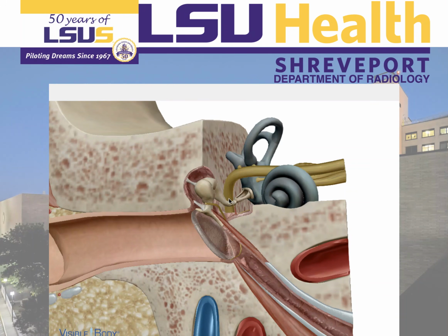The ossicles are not floating in the middle ear. They are supported by some ligaments that we cannot see on the CT. And if some question asks you which nerve is in the middle ear, it is this nerve here, the chorda tympani. It's a small branch from the facial nerve.